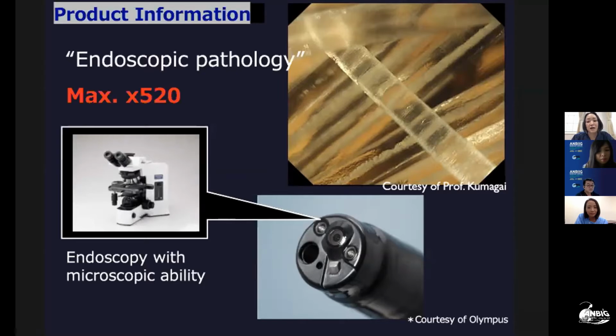This is the endocytoscopic observation of his white hair. So this endocytoscopy can be used as the usual scope with super high magnifying power. When he took this picture, he figured that his white hair was unexpectedly beautiful.